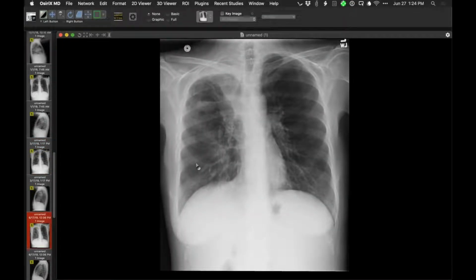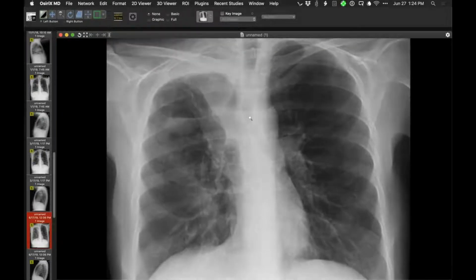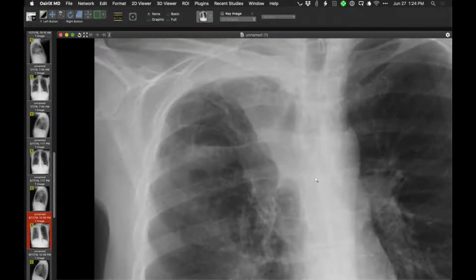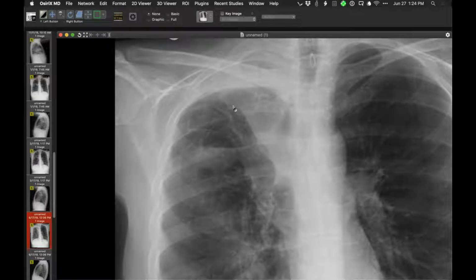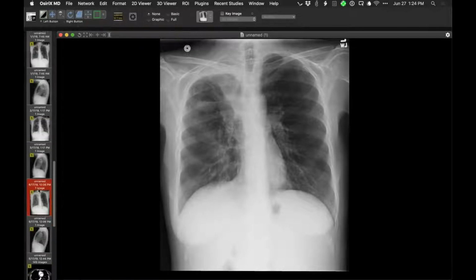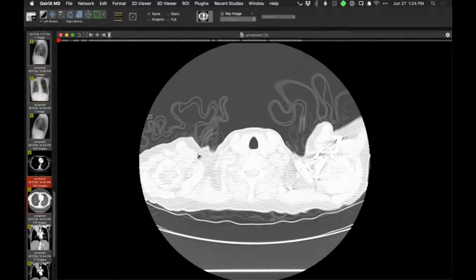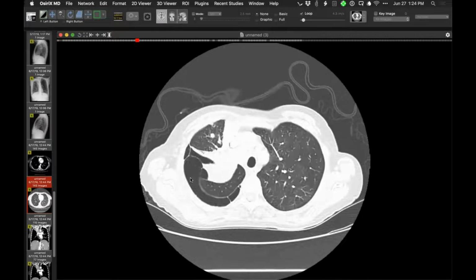So now we have findings for sure of substantial obstructive right upper lobe atelectasis. And then an unanticipated finding I will show you here is, in the absence of any intervention that we know of, a pneumothorax. So here's a pleural line, and I'll show you a CT in a moment. There is a pneumothorax at this time, and certainly very consistent with the entity of pneumothorax ex vacuo in the context of obstructive right upper lobe atelectasis.